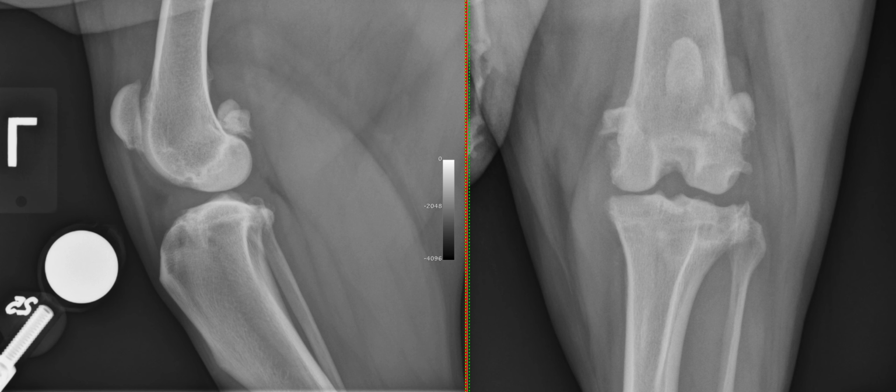Today's example is a 5-year-old female neutered crossbreed dog with acute onset of left hind lameness. Once you have reviewed the radiographs using your systematic approach, then you're ready to watch this video. Now, I will highlight the most important findings for the stifle in this case.